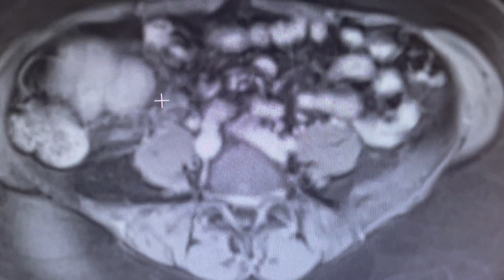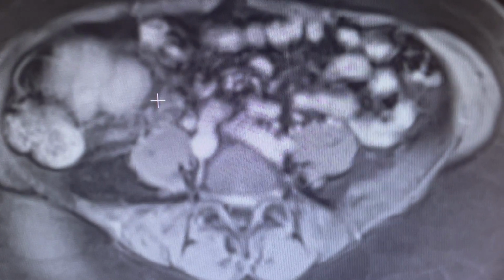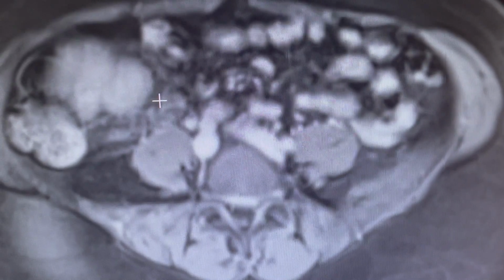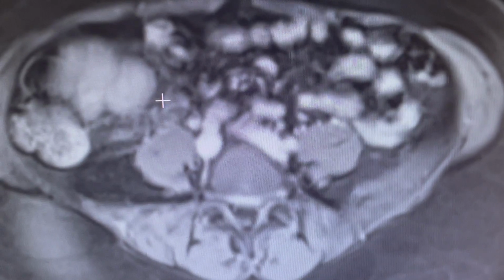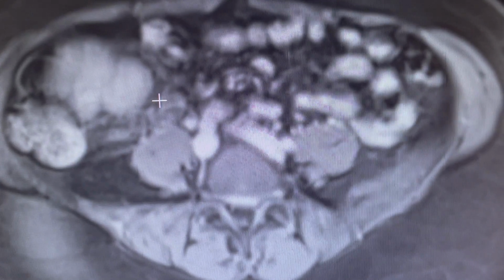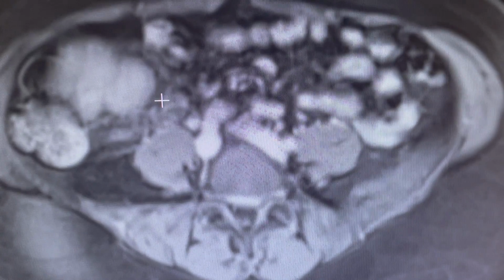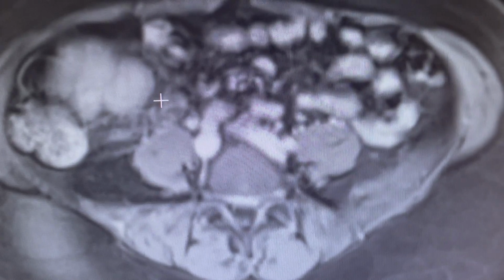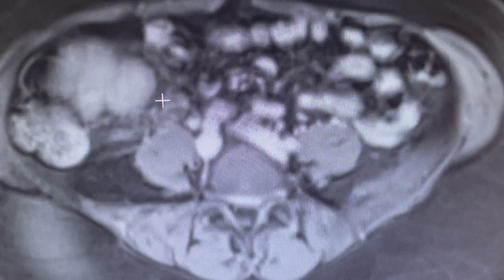Now, small hypervascular lesions, not bright on T2, fade to background. Those are the appearance of focal nodular hyperplasia or the family of hyperplastic liver lesions. Metastases, as I said, the small ones can fade to background. The big ones have to fade to background or wash out, and these didn't. HCCs, again, to reiterate, the bigger ones should wash out.